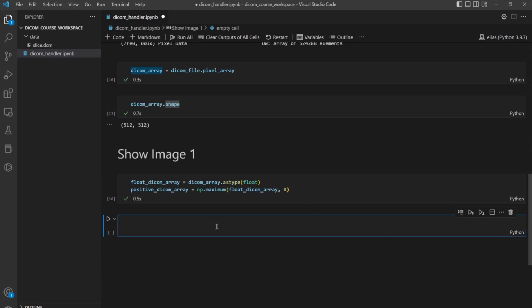The next step that we want to do is to convert the values, or normalize the values, between 0 and 1. So since they are already float, there is no problem, and we don't have any negative value, we just need to divide by the maximum. So what does it mean? If you have, for example, an array like 0, 4, 6, 5, 1, 6, something like that. If I tell you that I want this same array normalized, all the values inside this array should be between 0 and 1.